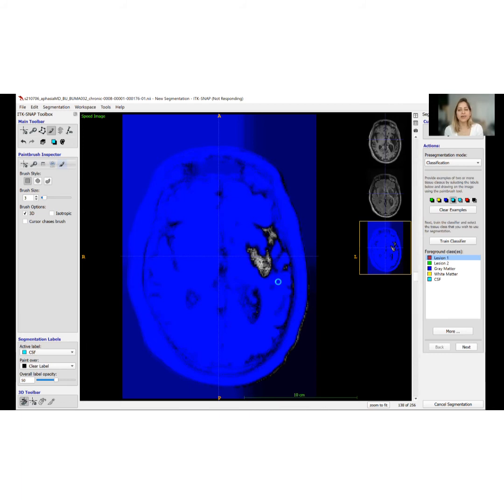But till now, it seems like it's done a decent job of classifying the different tissues. Mm-hmm. What we can tell. Yeah, and it'll be hard to tell until we do actually run the segmentation and then see the overlay on the T1. But yes, it's probably faster than going slice by slice and marking it. Wouldn't you say so? Oh, for sure, yes.